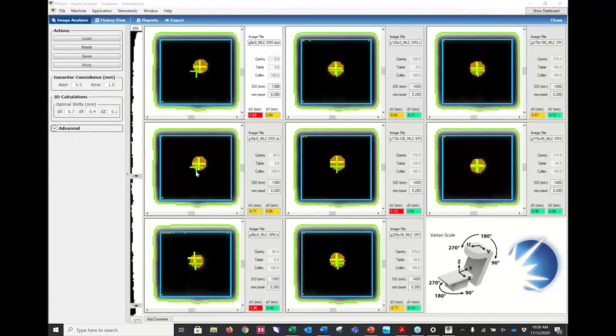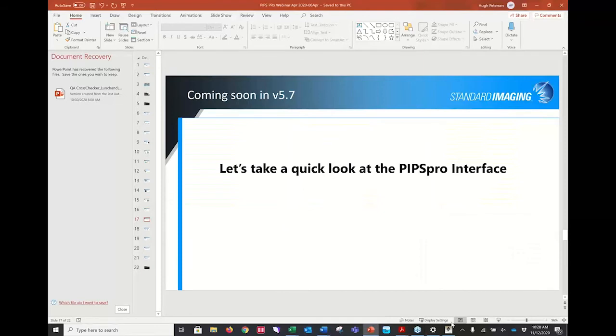Anyway, that's just a quick overview, I should say, of the PIPSpro software. This wasn't really intended today to be an in-depth demonstration. If you would like more of an in-depth demonstration, we can certainly oblige that.